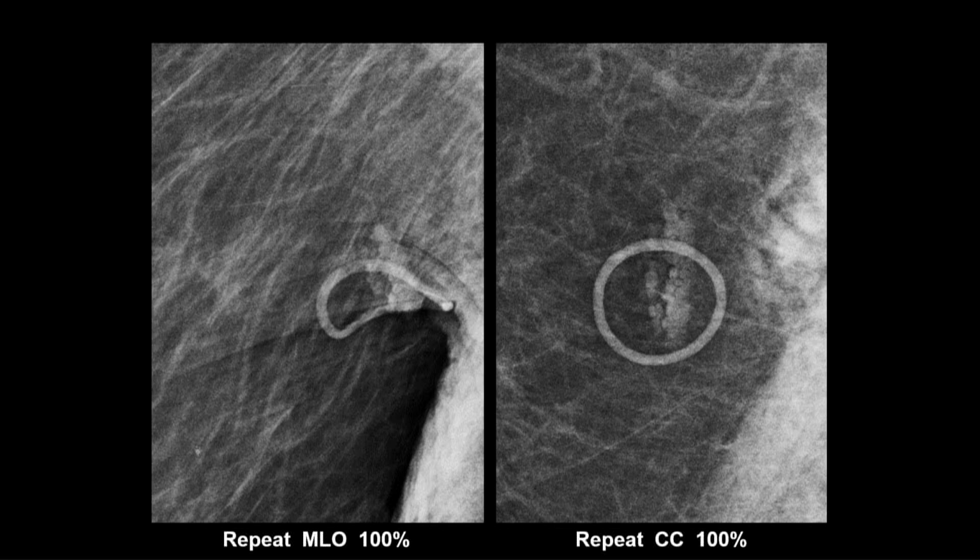If you have sessions with technologists, and I recommend that you do, where you teach them how to do things better, this would be a case to show. Because, without blaming a specific person, you can say, here's a case where the patient got recalled simply because the technologist didn't take a look. It only takes a second. And they're manipulating the breast anyway to position it.